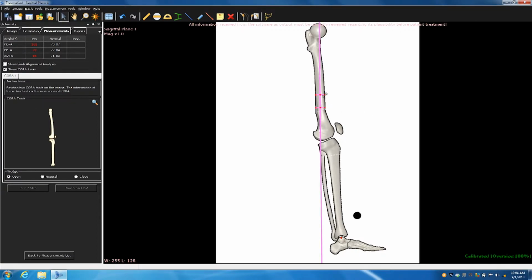So you should automatically say, why did we use the anatomic distal femur line to do our joint analysis? But in the course, we teach you to do the mechanical line, and it's a theoretical. Well, more than theoretical, it's kind of a methodology. And in the methodology, if you're going to analyze a bone, you need to analyze the entire bone. Does it really matter or not? It can. Now, can you get away with just doing the distal and looking proximally and say, I think we're okay?